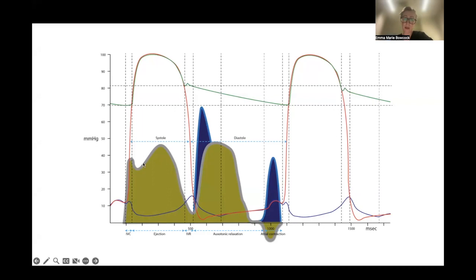So this is the pulmonary vein Doppler profile, and this is where it's happening in the Wiggers diagram, if you like. You have the systolic wave here as you're filling from your pulmonary veins into your left atrium in systole, and then in diastole, you get your big D wave. You see how the D wave of the pulmonary vein correlates with your E wave on your mitral inflow. And then your atrial contraction wave here in the pulmonary veins is obviously going backwards. And as I say, they should be equal in duration.